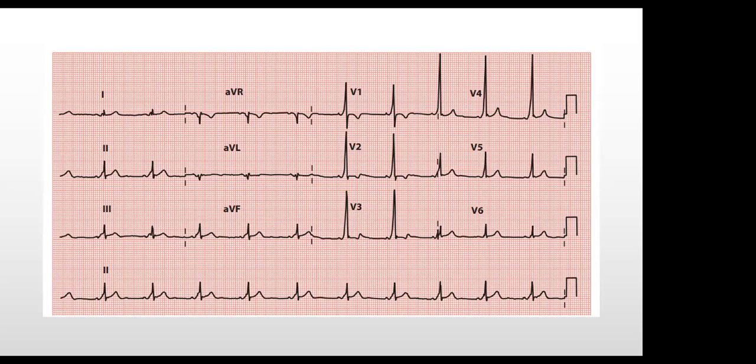For me, sir, this is a sinus rhythm, okay? Tell me, what's your evidence for sinus rhythm? Because every P wave is followed by a QRS complex. I see the P wave there, then I see the QRS complex. Okay.